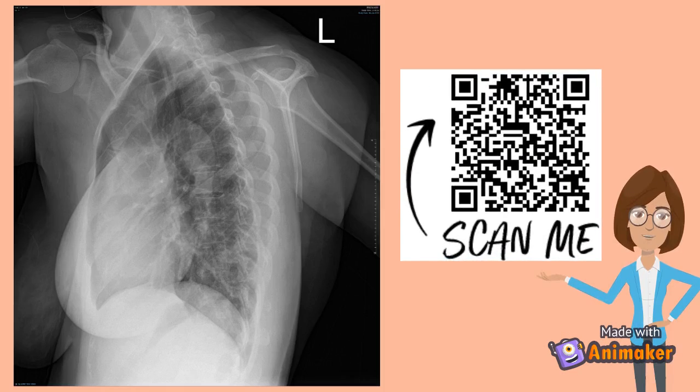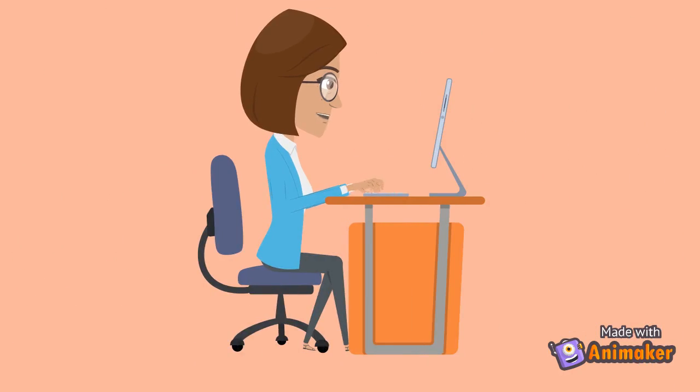Pause this video to concentrate on the image, and scan the QR code to access the answer sheet I provided. I will check your submission and respond to you via email.